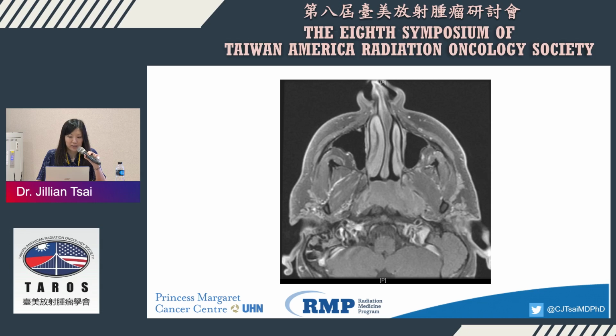So the MRI unequivocally showed a very significant nasopharyngeal cancer here, occupying the entire, let me see, you can actually not see my pointer, so I have to use this. Okay, can you see it now? Okay, so occupying the entire nasopharynx and parapharyngeal space.